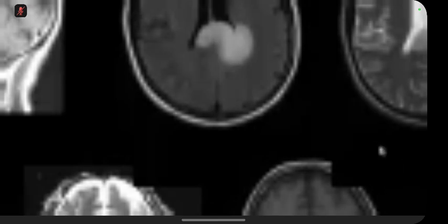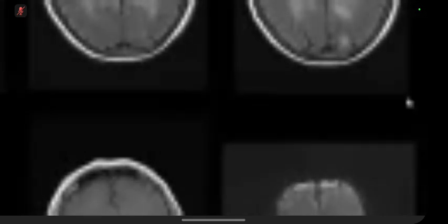Now, so this is tumefactive MS. Nobody can diagnose tumefactive MS just on the basis of a single image. You will consider things like lymphoma, etc. This is corpus callosum lesions in your book. And butterfly glioma and lymphoma are the top 2. I have already shown you this case previously.